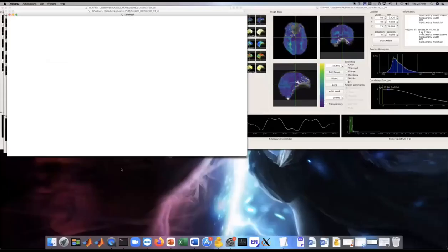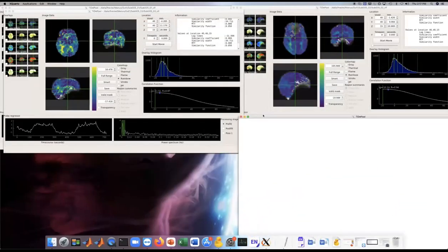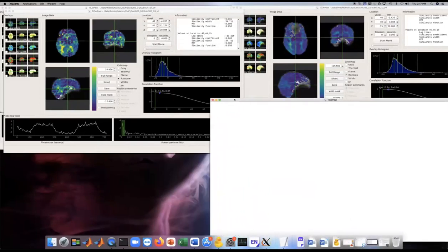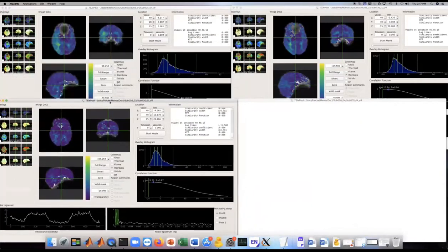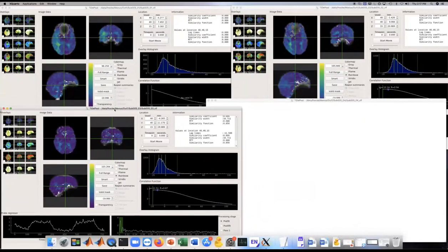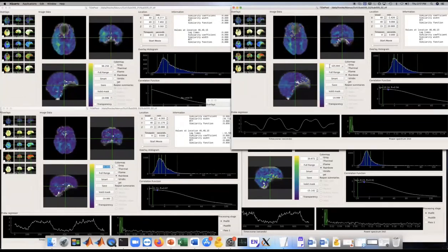But here you see already in the second Tidepool window is a decrease from the area which you've seen before, which had these very long delays on the right side. With more months passing, you see again a reduction, and in the 4th scan, when it comes, you see even less of the green yellowish areas when you adjust them all to the same search range.